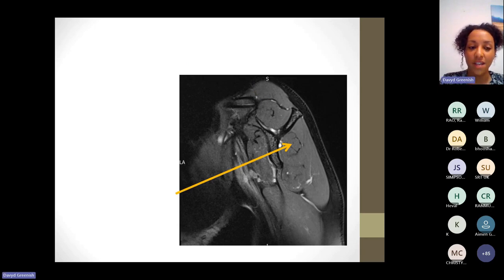Okay, how about this muscle? Any thoughts in the chat? Give you a second to orientate again. As you're thinking, I'll go through the structures that I use. So we've got the Y. This is going to be the scapula. Supraspinatus sits above the spine of the scapula. And yet we've got lots of infraspinatus getting posted in the chat. So this is the infraspinatus muscle. Perfect.